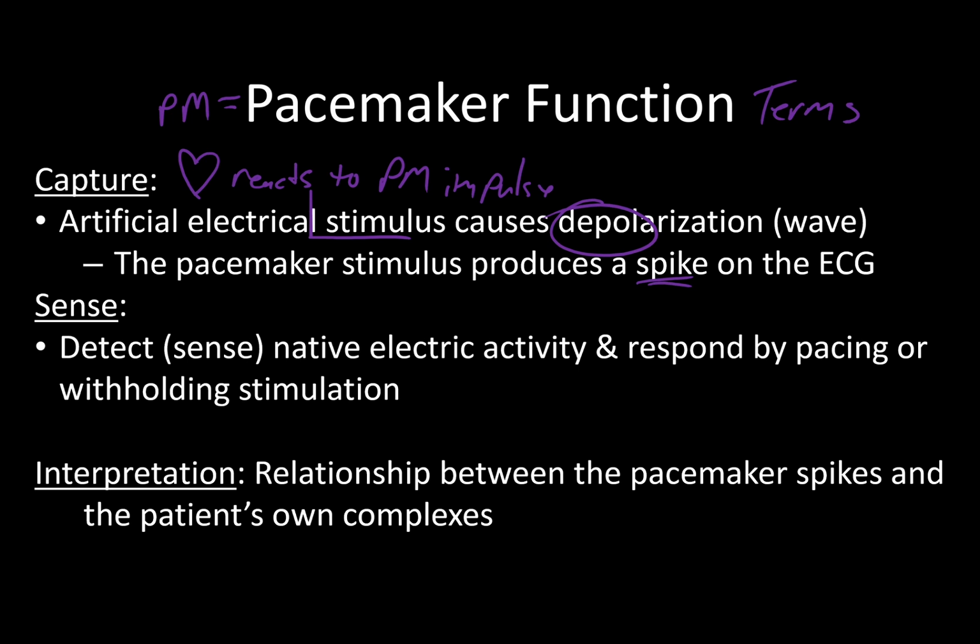But if you see the spike and then the heart depolarizes accordingly, you know that it's doing its job. That's one part. The second part is sensing. Sensing essentially comes down to the pacemaker, the generator, being able to read the heart and respond appropriately. This is the part that really makes the devices super smart.